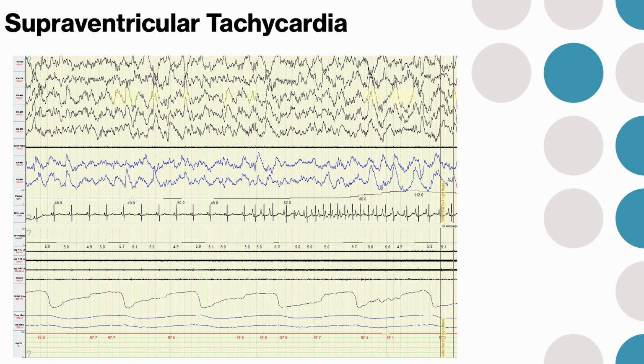And you can tell this is SVT because it's not just a fast heartbeat, because you have clear PQRST waves, PQRST, and then this happens where there's supposed to be 2 different waves here, but there's just one. I don't know if it's a P or a T. QRS should be a T, but it's either a P or a T. I don't know. And then they get faster here. It gets up to 112 right there. That's a little behind, but sometimes the heart rate or pulse can be a lagging indicator.